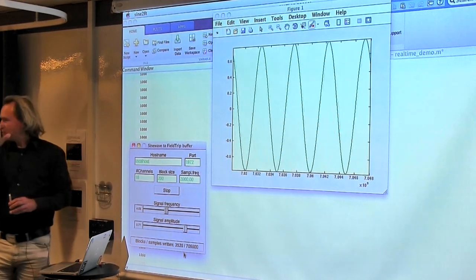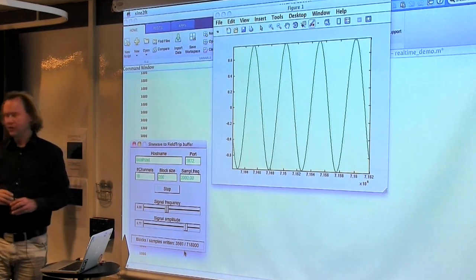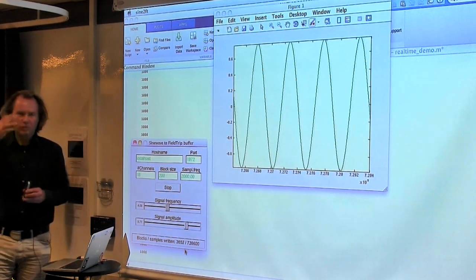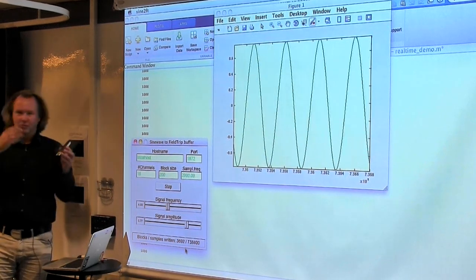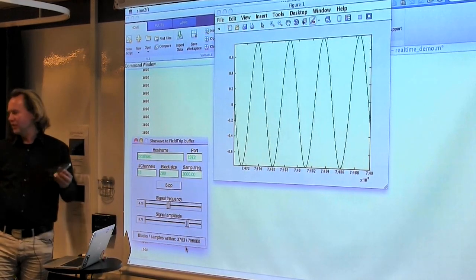The purpose of this demonstration is that it's really not that difficult to use a different programming language and a different computer for the analysis. Of course, Wi-Fi would not be the ideal network connection to do it fast, because there's a lot of overhead in getting the data from here to there, and there might be jitter, like maybe 100 or 200 millisecond jitter or so. But the most important is that it's quite easy to do.